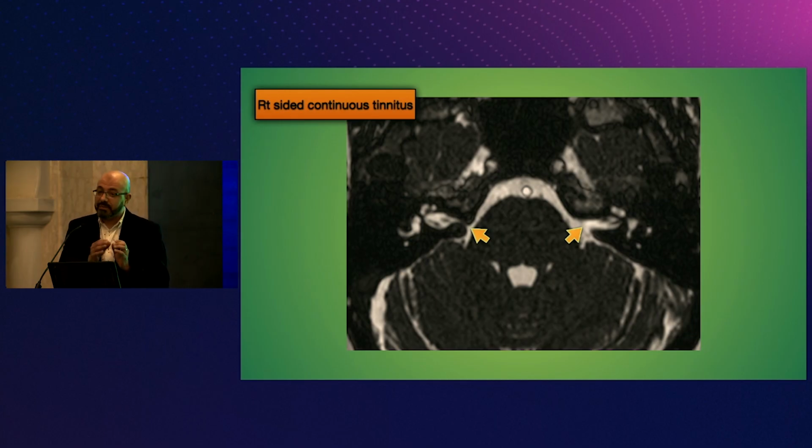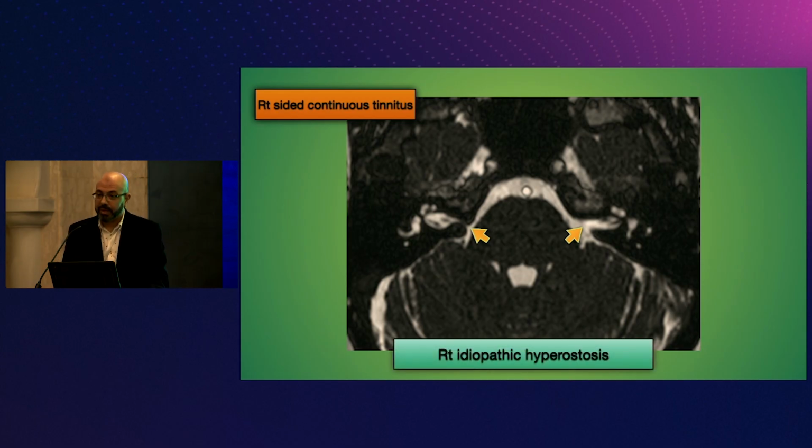The symptomatic side, it's very, very tight, which means that the nerves in between will be squeezed, and these are, of course, we know these nerves 7 and 8. 7 is a very resilient nerve, so it needs a lot of issues to cause facial nerve palsy here. Usually these patients will present with problems in the vestibulocochlear nerves first, and this is what we see in patients with idiopathic hyperostosis. However, we don't know why this happens. However, don't call it idiopathic until you see the patient again. You need to scan them with CT to make sure that actually there are no problems in the bone texture.